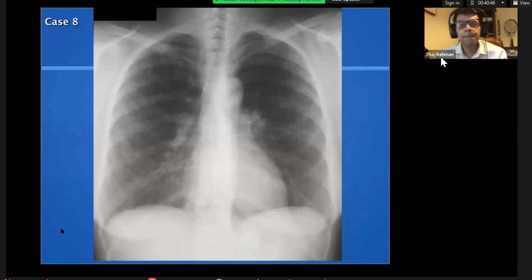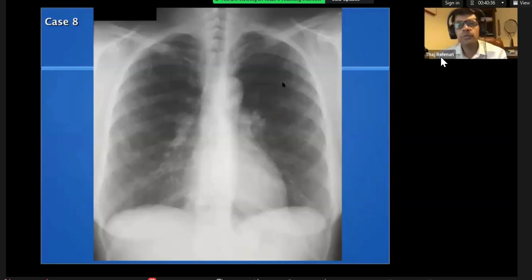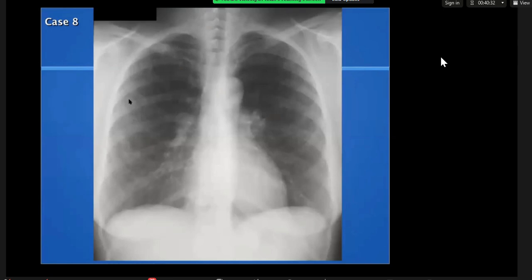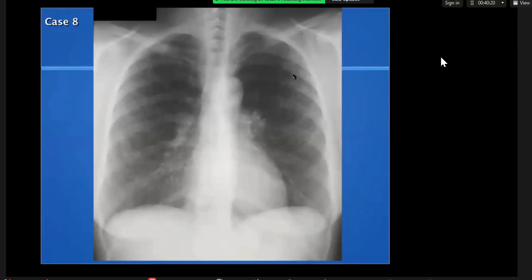Or in a young patient, also thinking along... I'm giving a clue. X-ray slightly. So there's some reticulonodular shadowing at the peripheries, is it? And some cystic changes as well. Are they reticular or are they more nodules? They're more nodules. Very good.